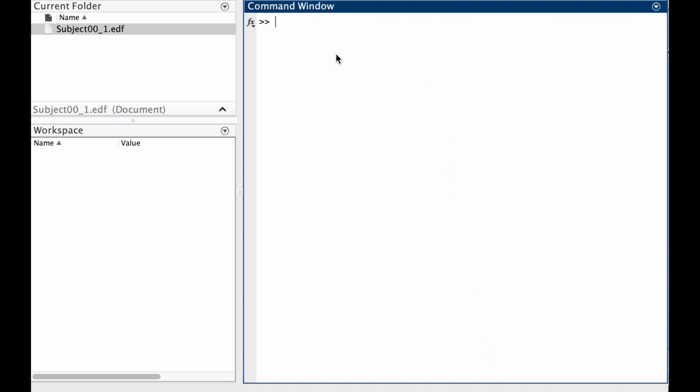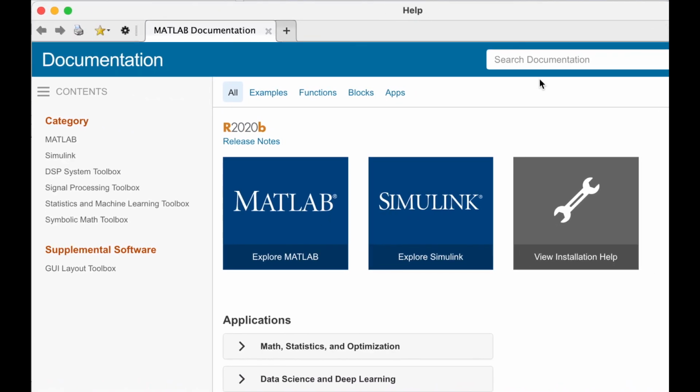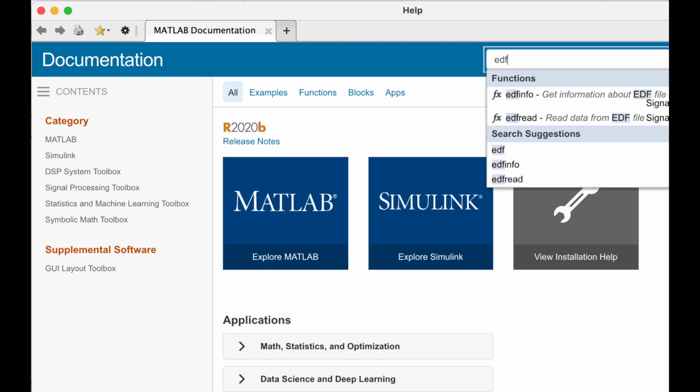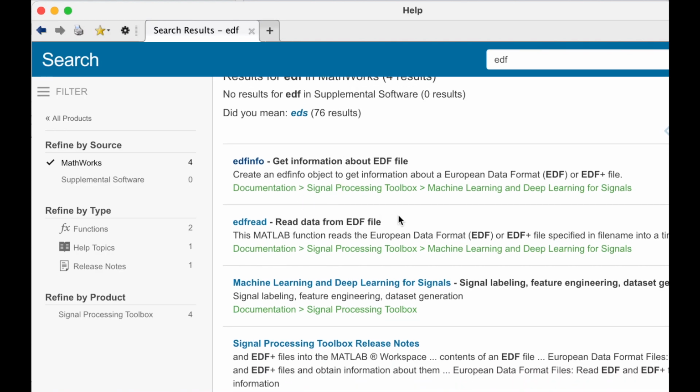We have explored using an external EDF function in one of the previous videos, but I didn't go into details because the details were inside the function. Anyways, I read the comments on the previous video and someone notified me that there is an update in MATLAB. Basically they included the capability to read EDF files inside of MATLAB, specifically under the Signal Processing Toolbox.